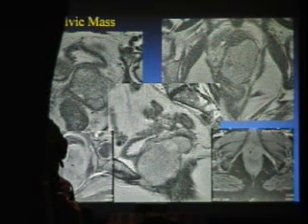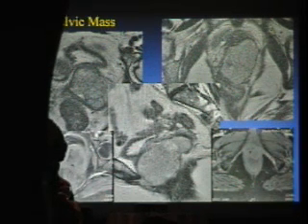But what I want to stress to you here is that when you're dealing with something unusual like this, first of all, MRI is by far the better test to diagnose and to stage these lesions. But you must be careful not to just talk about the mass and the size of it. You must stage it. We must be able to tell them clearly how the bladder wall interface relates, what the rectal wall looks like, what the pelvic side walls look like. Think of what the surgeon needs to know. She, or he, doesn't need you to tell them there's a mass.